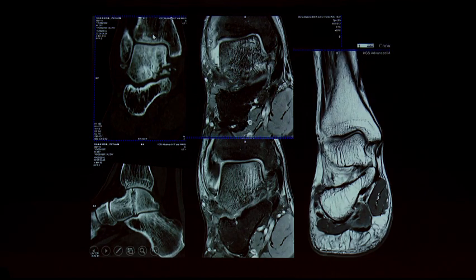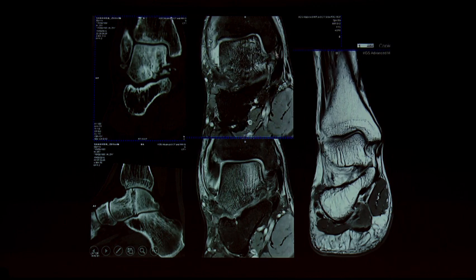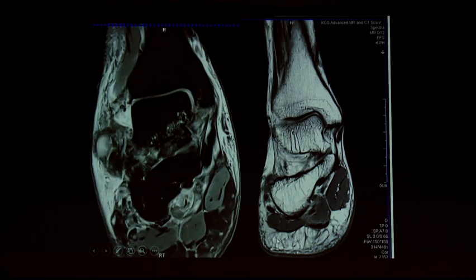Abnormal medial ligament is usually seen with the fractures. You can see there is a fracture of the talus, complete rupture of deep fibers. You can see the deep fibers of the deltoid totally gone. For normal, I have shown over here. You can see the normal deep fibers. It is a tibiotalar ligament. It is totally gone, and it is showing the bright signals. Always we have to carefully look.